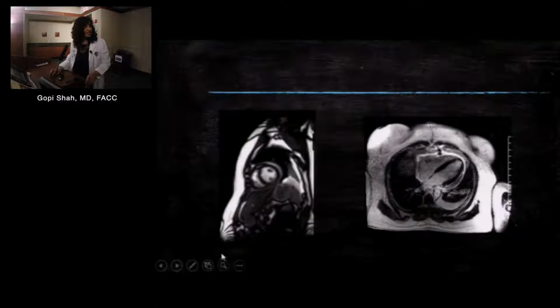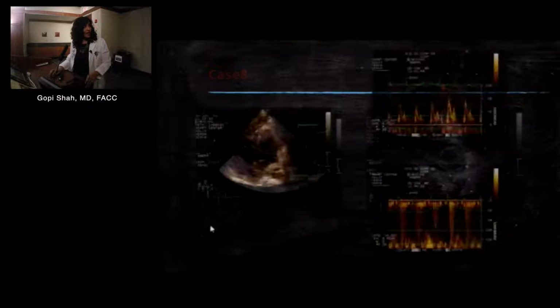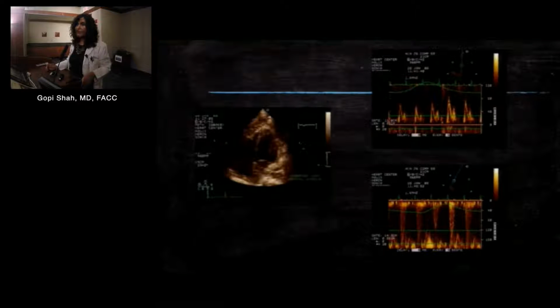This patient also had additional imaging done, and you can see the pericardium light up here, and you can see it in this modality as a white thickening. And so I believe constriction is one where additional imaging definitely has a role, particularly if you're planning an intervention.